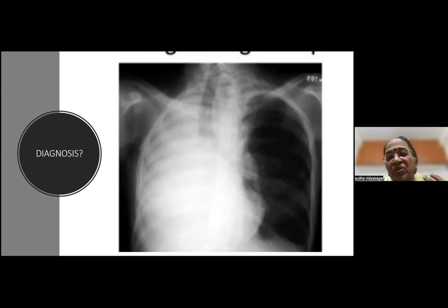And remember, though we said everything must be ideally exposed, correctly penetrated, it never happens in real life. So you have to have some kind of course correction in your mind, so that you adjust for all these irregularities that happen. So let's look at it. Obviously, if there is a pneumothorax, you should have had an edge of the collapsed lung here, which is not there. And you should not have had anything on this side. This poor lung, what did it do? If this is a pneumothorax, this one should have been all right. This one is not all right. So this is not the abnormal thing. This is the abnormal side.